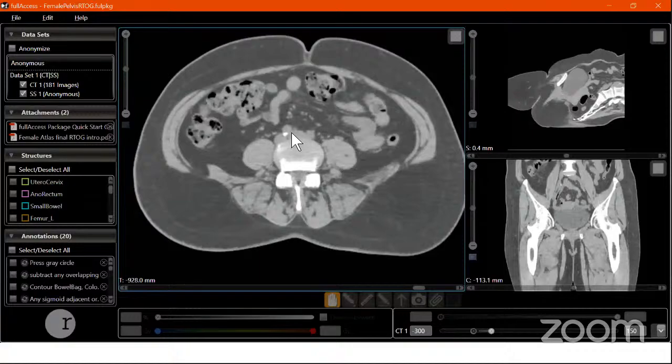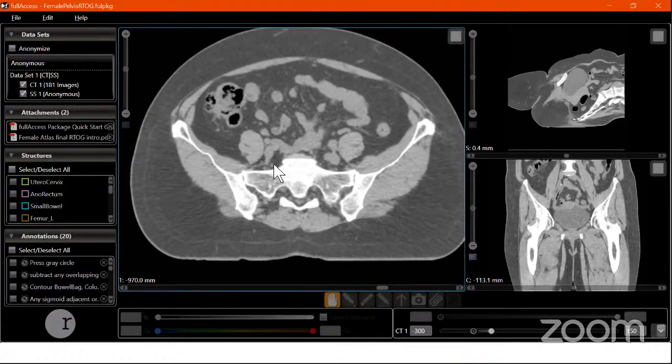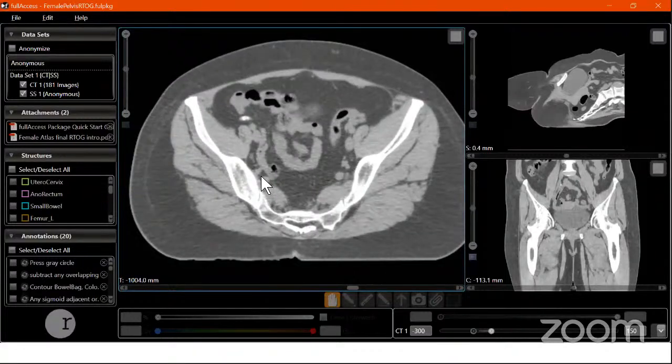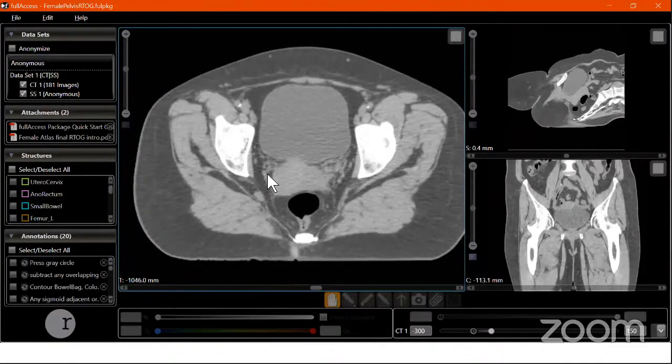The individual modifications that might be required, let me come down and look at the internal iliac. This is the internal iliac that is coming down, the internal iliac vessels. The 7 millimeter applies to even the internal iliac. So let's do all that for both the vessels, external iliac and internal iliac.